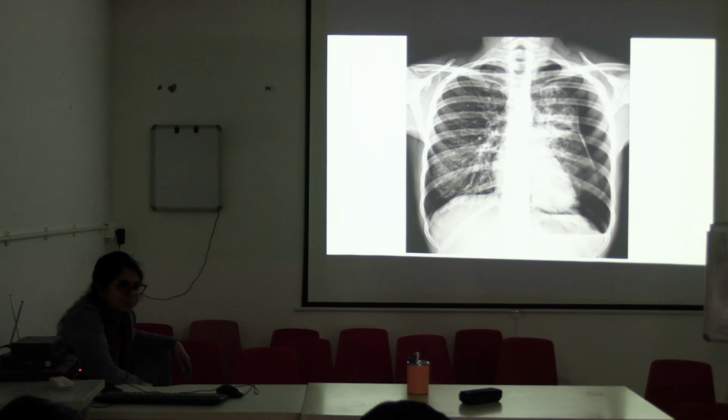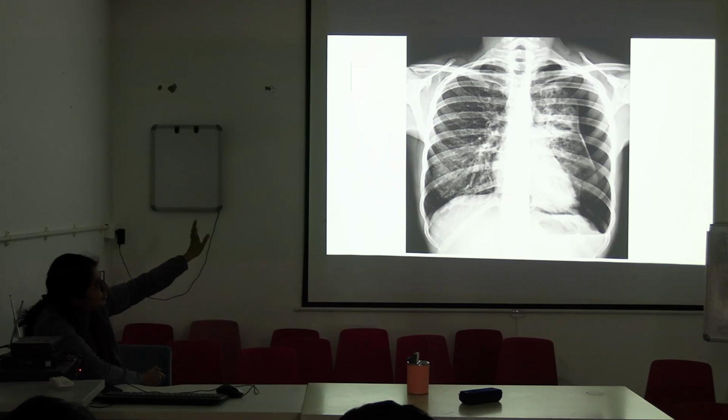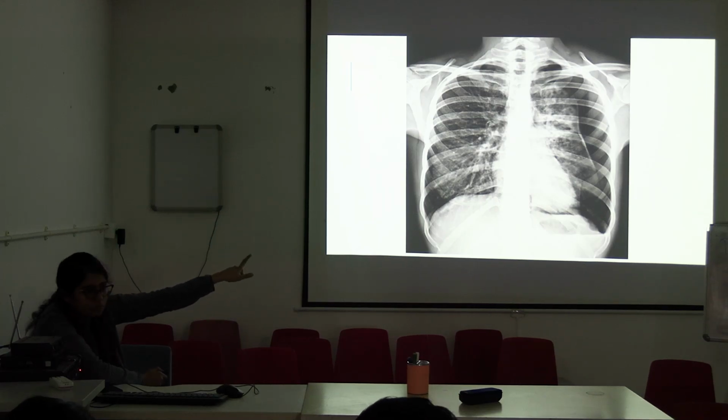ভালো করে দেখো। কি কি দেখছো? কোন কোন প্যারামিটার? Which parameters will you see to describe mediastinal shift? Position of trachea. শিফট করেছে, একটু বেশি রাইটে চলে গেছে, দেখো অতটা কিন্তু বেশি সেন্ট্রালে নেই, তাহলে এই দিকটা ঠেলছে। আর কার্ডিয়াক শ্যাডোটা অতটা ডিসপ্লেস হয়নি এখনো, বাট স্টিল there are signs of a little bit of mediastinal displacement because the amount of pneumothorax in the left side is more.